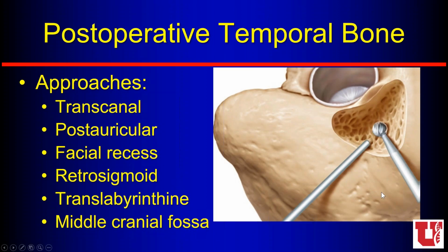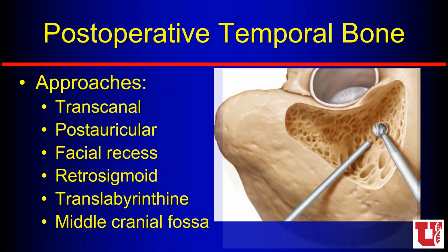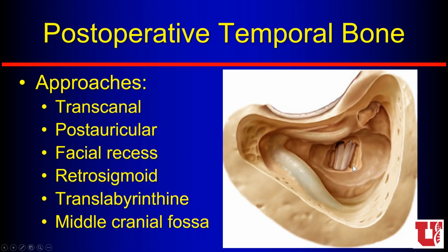Sometimes they're just taking out some of the lateral mastoid air cells, but sometimes they're going deeper and trying to get down to the middle ear structures in those areas. So when they think about where exactly the facial nerve tympanic segment is, where the cochlear promontory is and all these structures, and how they get to the ossicles through a transmastoid approach, it's very different than how we think about it on cross-sectional imaging. And they can actually go all the way through and reach the internal auditory canal from this approach itself.